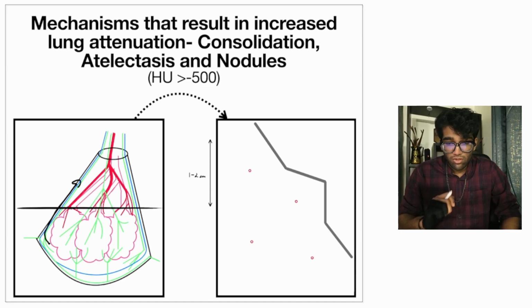There is one more called a ground glass opacity. A ground glass opacity essentially is any of these opacities that is so small that it cannot be resolved as multiple separate pixels or multiple separate imaging points in the image, and therefore is shown like a haze, and it appears like you're looking through a tinted glass window. That haze allows you to see the underlying bronchopulmonary architecture, but it is not as black as the rest of the lung.